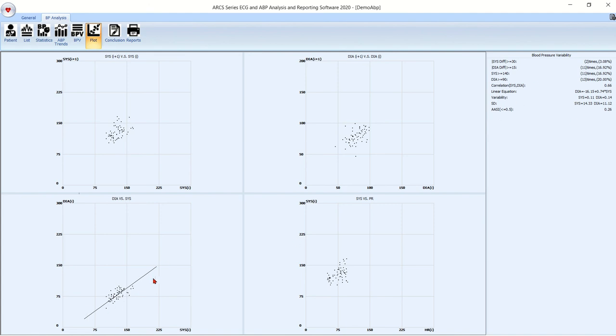And each of these Lorenz type plots indicates the display or the placement between diastole and systole. Ideally, you're along the 45 degree angle as shown here.